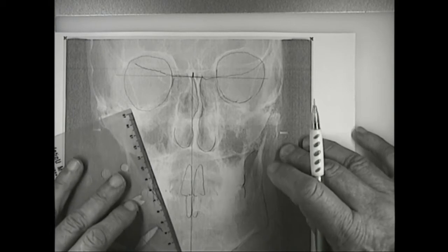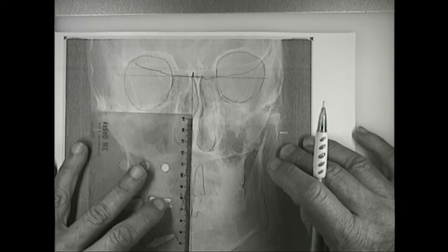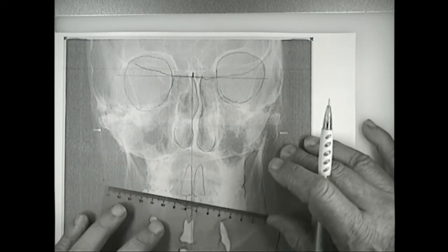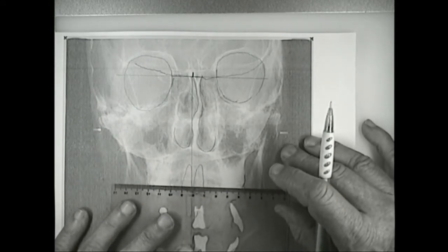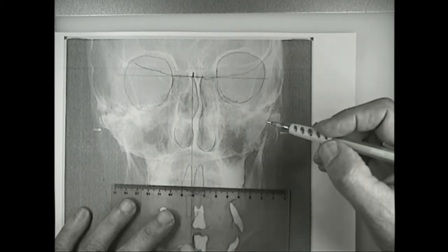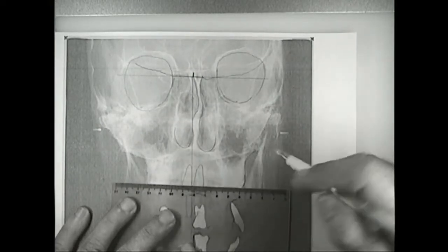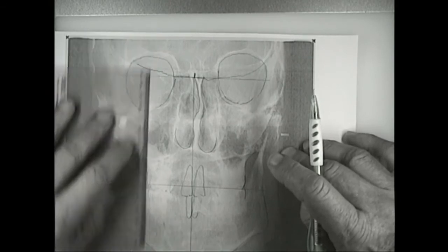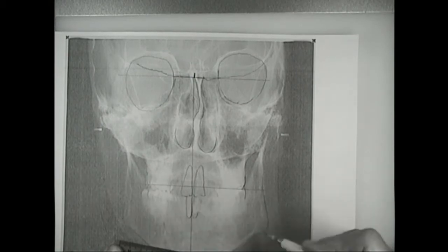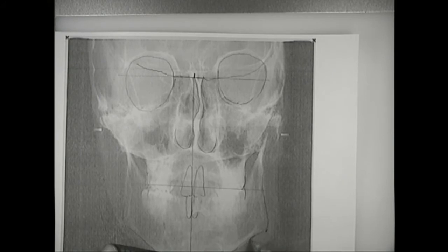Now the important thing here for us is that it looks like the dental midlines, his occlusion is already aligned. So the midline, I don't want to disturb the midline, but I can see according to the clinical that to me there's a bigger cant on that clinical than I see here. You see that the cant is not that big, and I'm looking at the gonial angles. I can measure it there. I can look at it there. I can look at the antigonial notch.